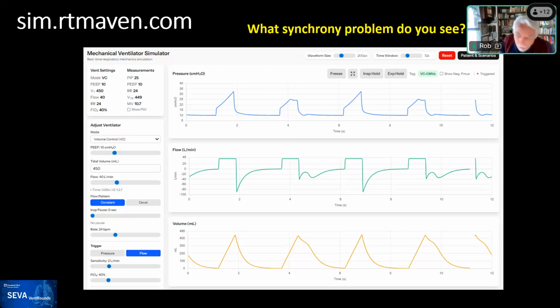And I don't remember whether or not there's cardiac oscillations in this model or not, but in this case, we don't see any. But you should think of this in the same way you think of learning ECG patterns. So when you're learning ECGs, you get these waveforms in the textbooks, and they're more or less ideal waveforms. They don't have a lot of noise. They're designed to show you specifically one type of problem. And that's how these waveforms work.